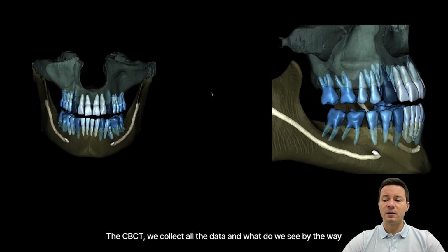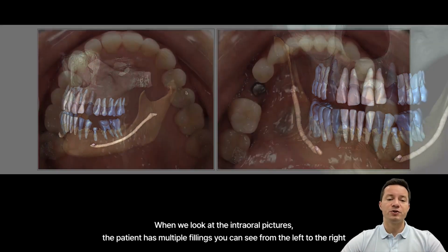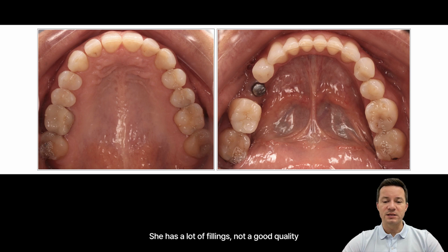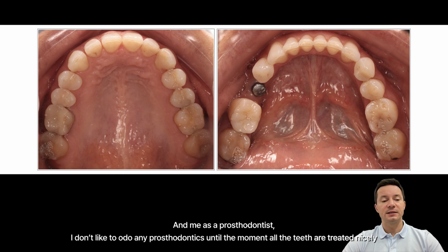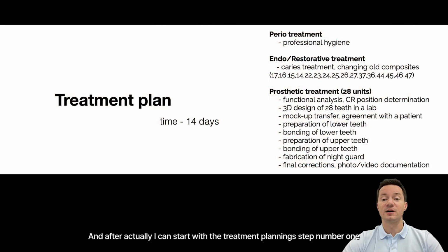We collect the CBCT and all the data, and when we look at the intraoral pictures, we see that the patient has multiple fillings. You can see from left to right, she has a lot of fillings, not of good quality. We can see signs of caries on some of the teeth. As a prosthodontist, I don't like to do any prosthetic work until all the teeth are treated nicely. So I usually tell this patient to first treat their teeth, and our other specialists in the office would change all of the old fillings to new ones. After that, I can start with the treatment planning.